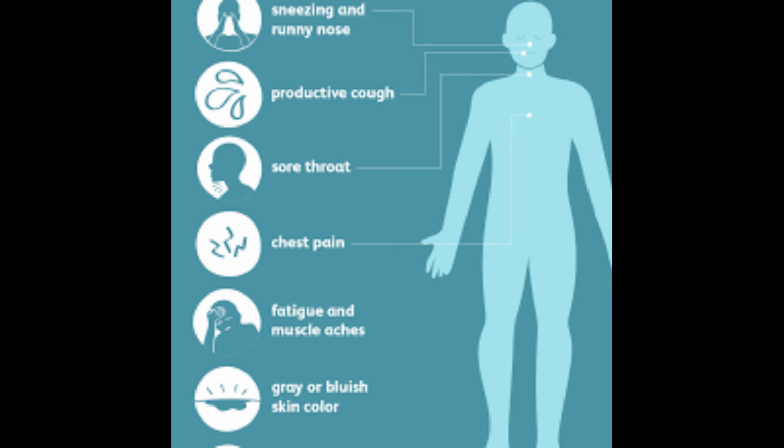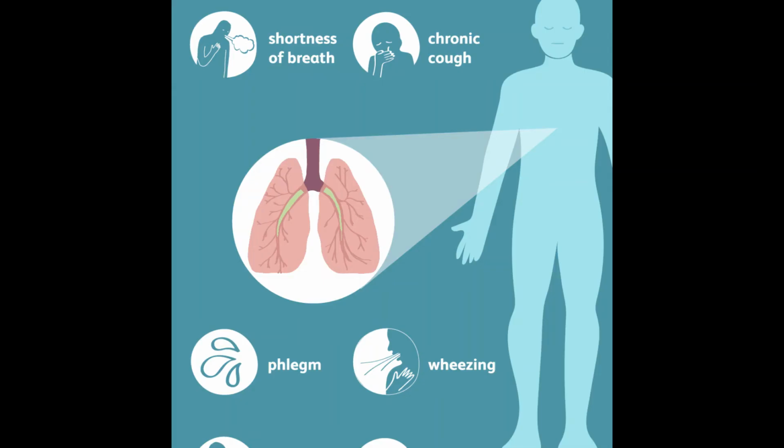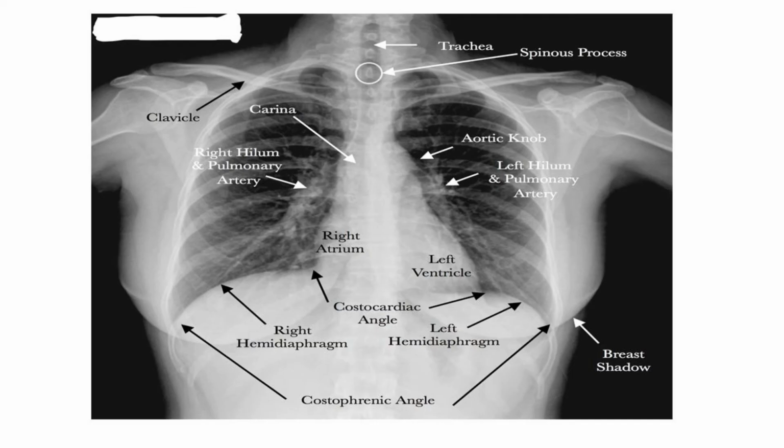Chest x-ray is typically the first imaging test used to help diagnose symptoms such as breathing difficulties, cough, chest pain, injury, fever, shortness of breath, and many more. The chest x-ray is also performed to evaluate the lung, heart, chest wall, and the chest x-ray produces images of the heart, lung, airways, blood vessels, and the bones of spine and the chest.